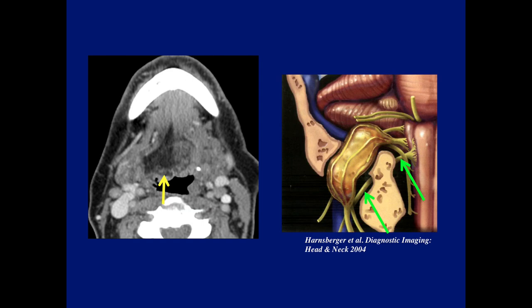Correct. As Gino said, Asif, Eric, there's atrophy of the tongue musculature here, the intrinsic musculature of the tongue, with fatty replacement. So this one patient, because he had the lesion in the region of the jugular foramen, had the 10th involved, the 11th, and also the 12th. And if we look now here, which I'll talk about next time, this is the 12th nerve that does not go to the jugular foramen, but goes to the hypoglossal canal, which is right next.